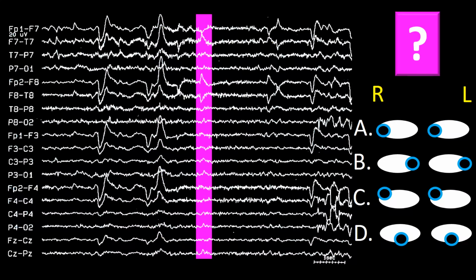Next question. Please take a look at this frame and decide what is the best answer. You have 4 choices from A to D. Stop the recording if you like to take a few minutes to answer this question.